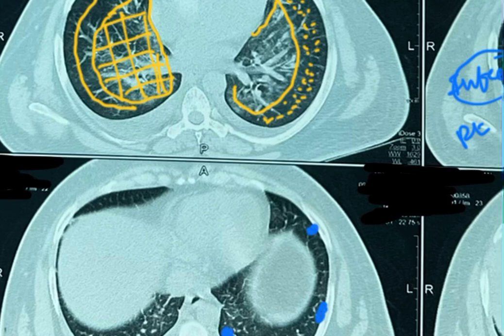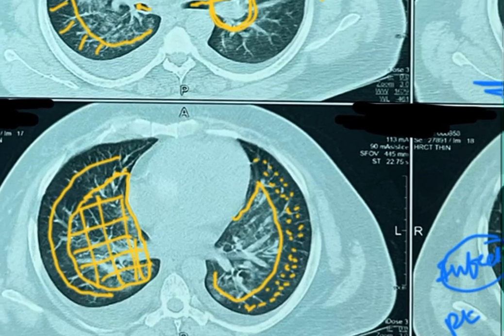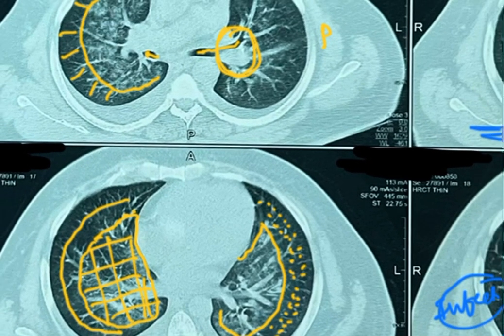You will get lesions in the center as well, but the main lesions will be almost always subpleural, patchy, bilateral involvement. If it is very much less involvement, it can be unilateral as well. But the typical feature is usually bilateral, subpleural, patchy involvement.